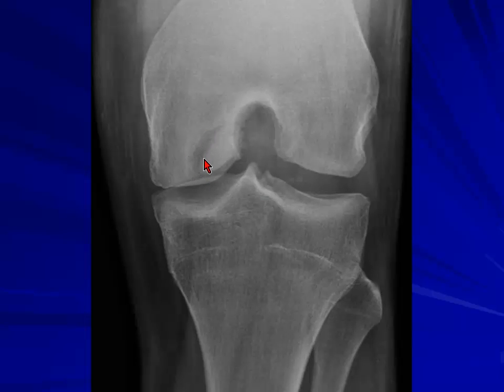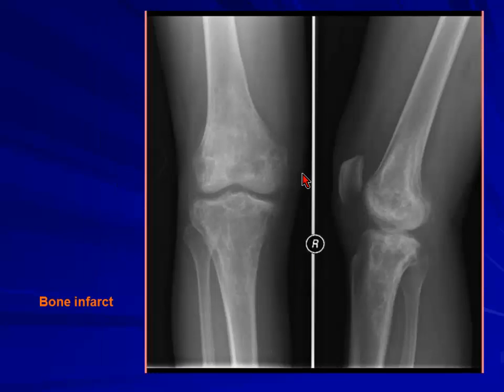This basically needs intervention: either they rest and take painkillers, otherwise they need to put a scope in and take this fragment off. Now if you go back and look at what I said about the femur, these are thread-like dense trabeculae. So it's involving the whole marrow and probably destroying.